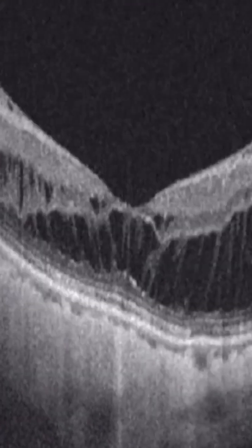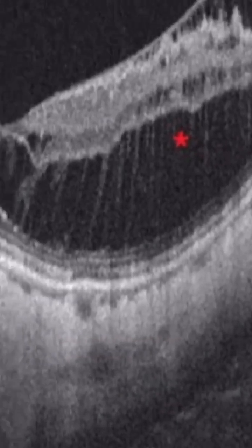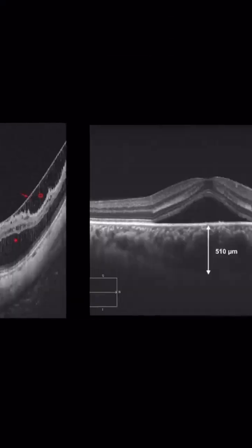Now, how do you know if it's the sclera or the choroid? Well, if you look at the texture of it, the sclera has a uniform pattern, right? You can see it's hyperreflective and there is absolutely nothing going on here. It's just white and reflective. The choroid, as you can see in all the scans here, has texture because it's a mix of blood vessels. So you have hyper and hyporeflective. This is what the choroid looks like, right?